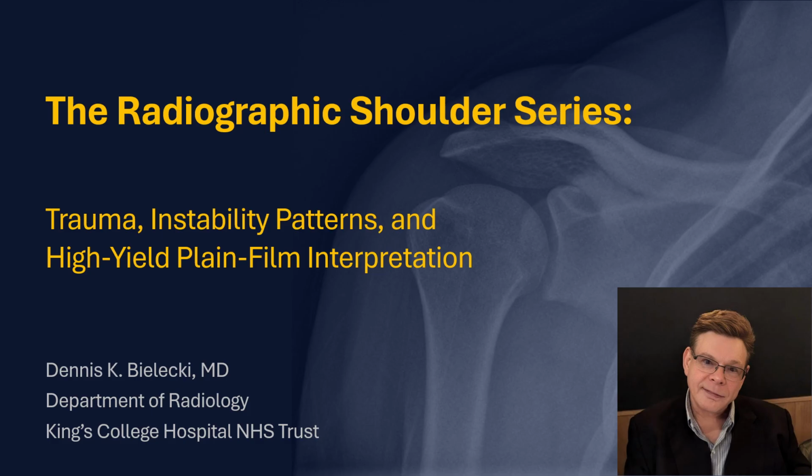What changes management? If you leave with one thing, it should be this: a disciplined, repeatable framework for reading shoulder radiographs so that nothing important is missed, especially posterior dislocation, glenoid rim fractures, and cuff insufficiency. Let's begin with projection accuracy.